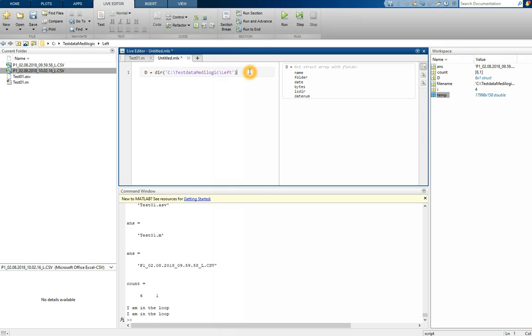So you're jumping to the end of your command, and by hitting enter you get more rows, but by hitting section break you get a separate section, and you can change this section to text, and then you can type in an info text for this specific part. By hitting the section break we get back to code, because per default you're getting a code line, and you can change it there or back to a code line.